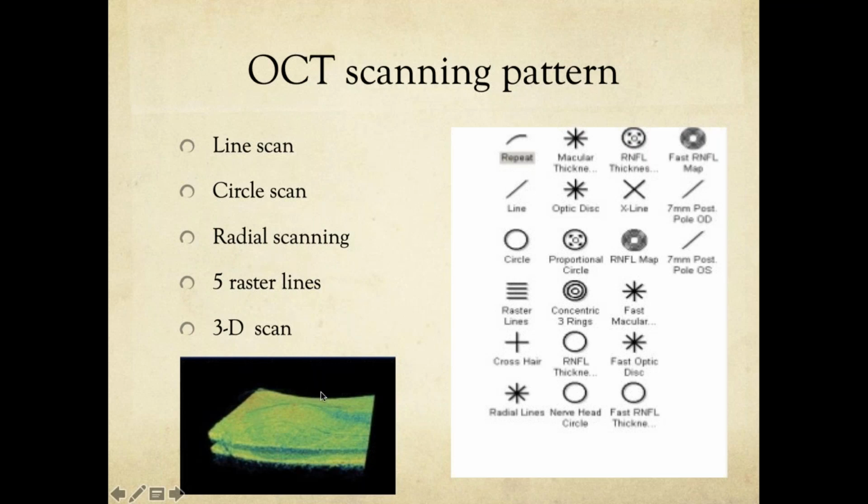If the CSCR has resolved and you want the patient to be checked and you just want to focus on the fovea, if you just take a snap, not a scan of the whole retina, just one slice, then I'll do a line scan that will be directly focused on the fovea. This way, all of the imaging resolution of the OCT will be focused on only a single plane, hence producing a very high resolution image at a single spot.